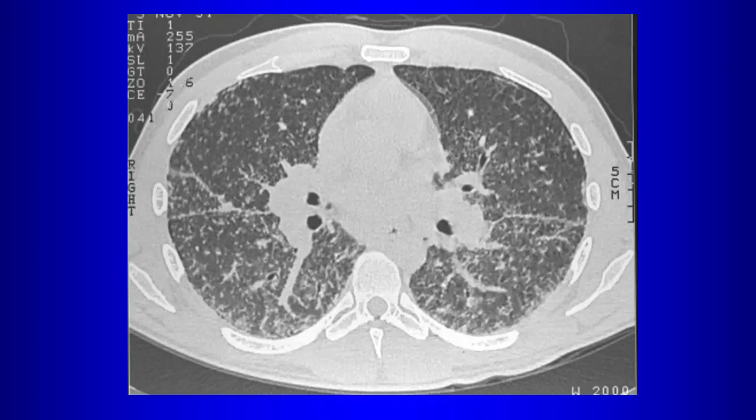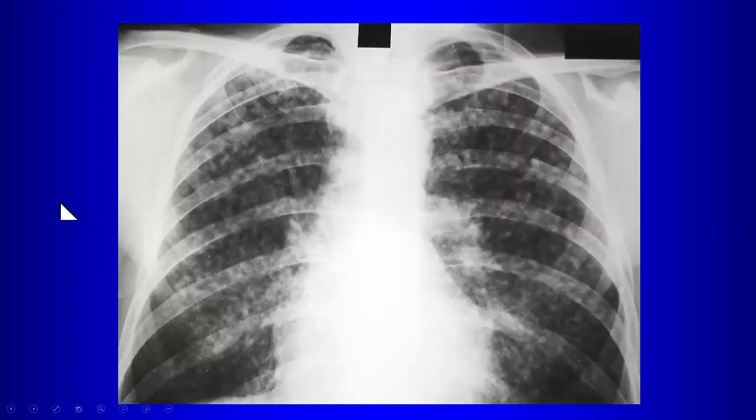I haven't shown you the upper and lower regions of the lungs, but there's also a difference in the distribution. What's different about the distribution of sarcoid versus lymphangitic carcinomatosis? Sarcoid favors a mid to upper lung distribution, whereas lymphangitic carcinomatosis is usually more of a lower lung distribution. Right? But this was a case of sarcoid. Okay. So there's another patient with nodules.